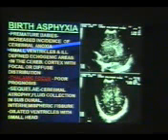The sequelae result in cerebral atrophy, fluid collection in the subdural interhemispheric fissure, and dilated ventricles with a small head. And if this anoxia is sustained for a longer time, it results in ischemia and then gliosis. So this is birth asphyxia, a diffuse highly echogenic pattern seen in the parietal lobe.